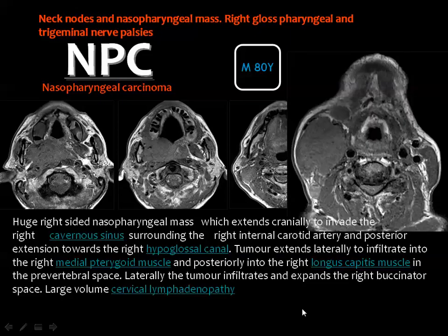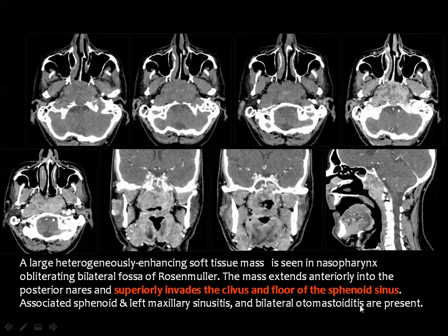And this is the lymph node mass, which is considered one of the clinical presentations of nasopharyngeal carcinoma, since the patient may not feel the primary tumor at all, but it may present by bulky lymphadenopathy due to metastatic involvement. And this is an example of nasopharyngeal carcinoma, which is located exactly in the midline.